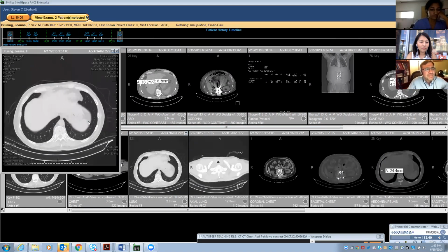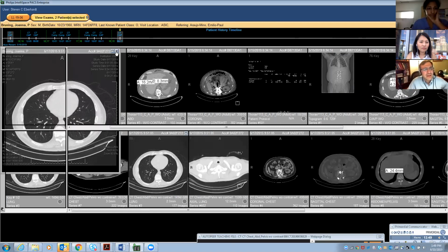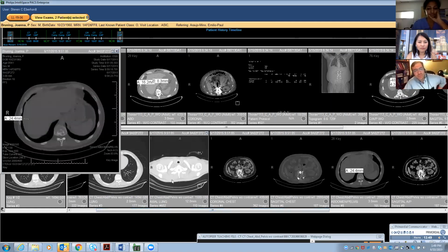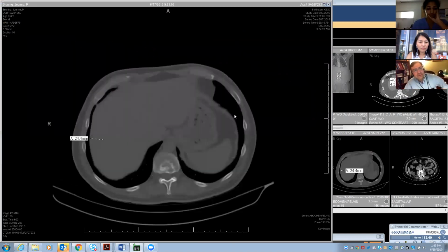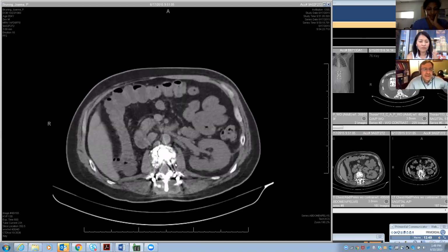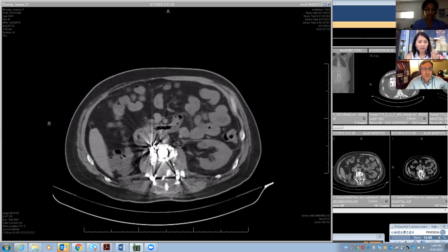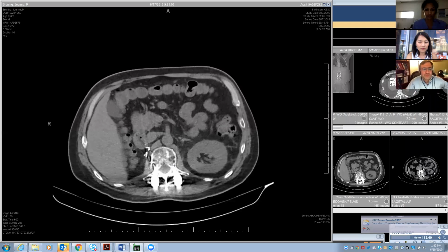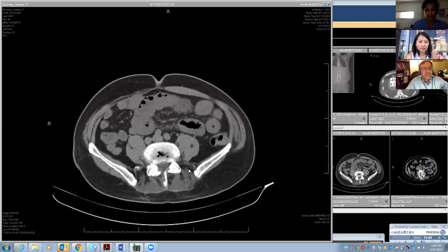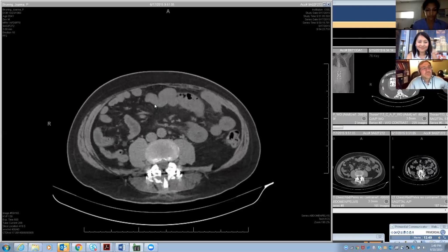By this time, this 2015 exam, some of the metastases in the lung and in the liver were already improving. But I just grabbed this one to show you that there wasn't any ascites. The patient had their nephrectomy already. And then this surgical procedure in the spine was done with corpectomy and posterior fusion at a site of metastatic disease to the spine. So really what I'm showing this case for is what subsequently happened.